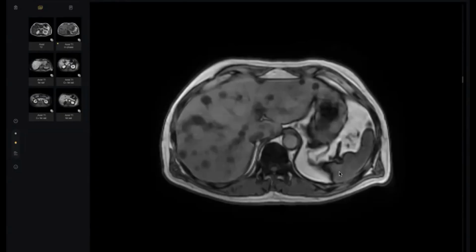Give me evidence from this image that the T1 out-of-phase suppresses only microscopic fat. The subcutaneous fat is still bright. Brilliant, Dr. Nagam. And the intra-abdominal fat. Excellent. Look here, my colleagues, subcutaneous and intra-abdominal fat are macroscopic, not suppressed. Not suppressed in comparison to the fat here.